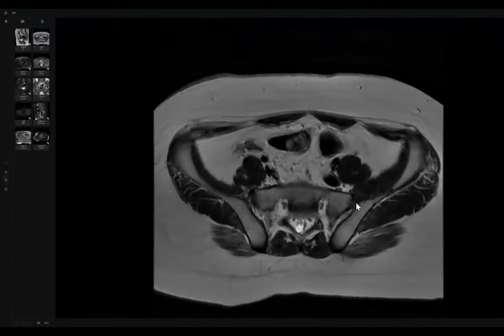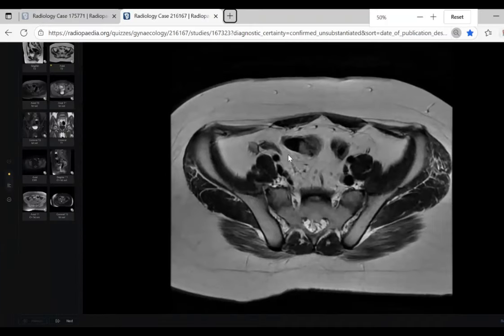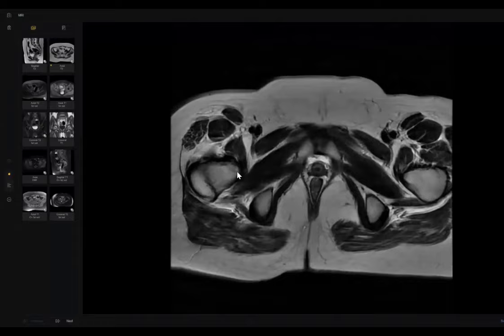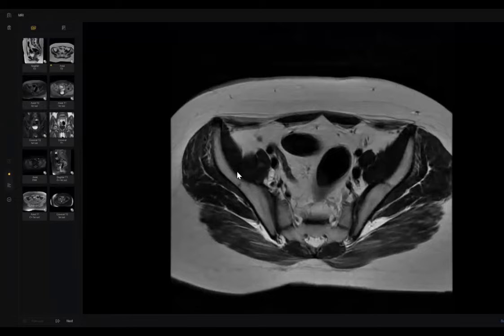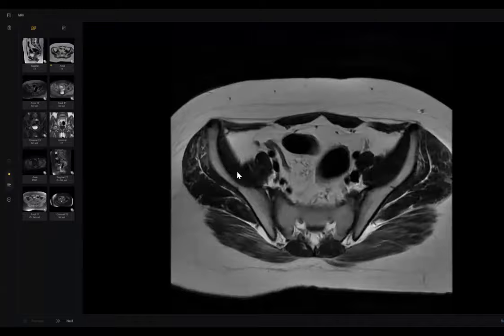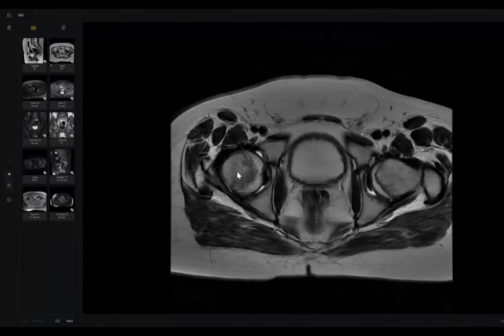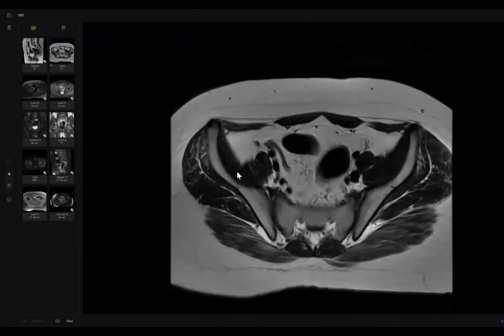I will go down to see any testicular organ or anything like this. Did you find anything? Can I scroll for myself, please? One by one.